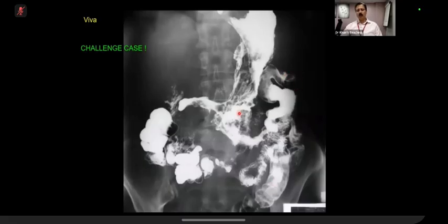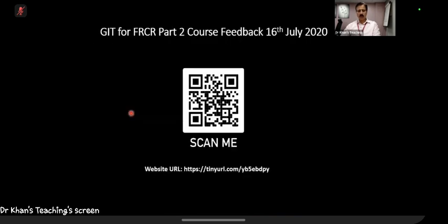On the other hand, there must be a fistula with a bit of jejunum also, either through the transverse colon or directly, because part of the contrast has gone into the jejunum. Now, what is happening? In the distal large bowel, small bowel, there is not enough contrast, and this is the ascending colon or the hepatic flexure where the contrast has gone. It does not go all the way around. So this is the type of film in which you have to stretch your imagination, should I say. Is the contrast at the right location or not? Okay.